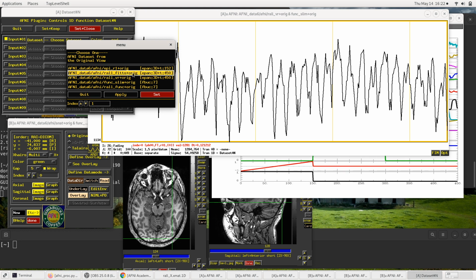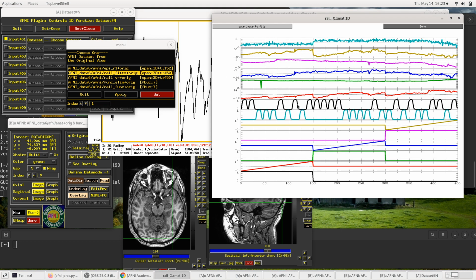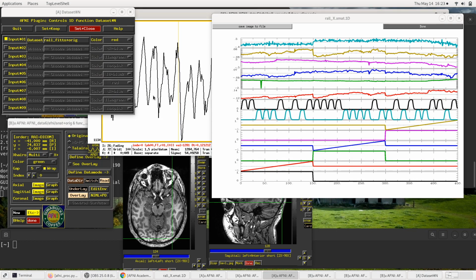So again, this is 3dDeconvolve fitting the model components, all these components: 6 polynomial terms, 2 regressors of interest, and 6 more motion terms. At each voxel independently, it adds up some multiple of these 14 regressors to get close to the data. And let's see how it did.